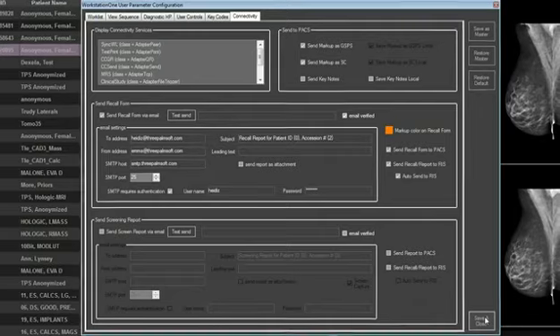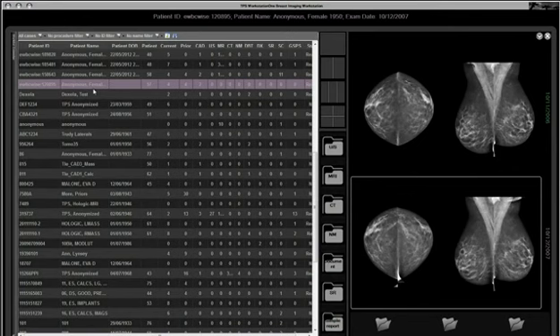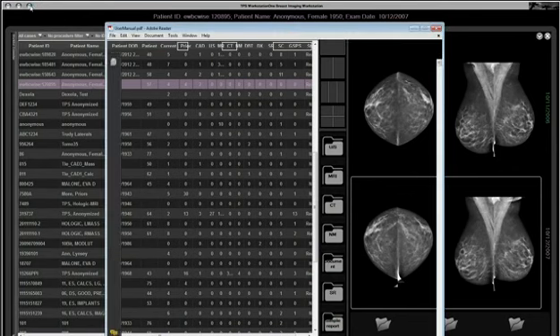Any questions? Access the user manual for reference at any time by clicking on the third button at the top left-hand corner of your navigation screen.